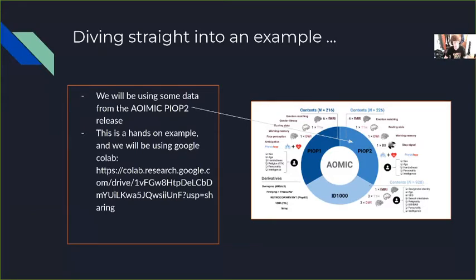And we're going to be using Google Colab for this. I don't really love Google Colab, but basically, if people aren't familiar, it's like a free version of Jupyter Notebook, but it runs in your browser and it runs on Google clusters somewhere.